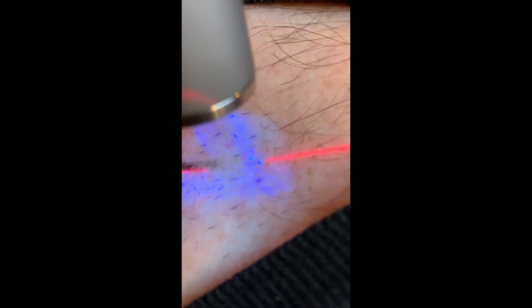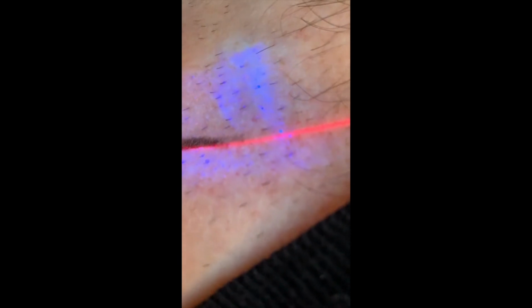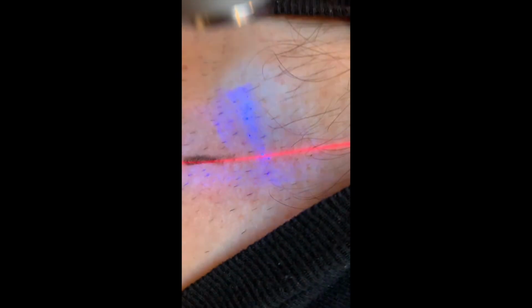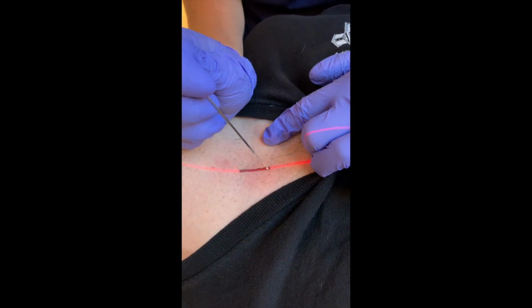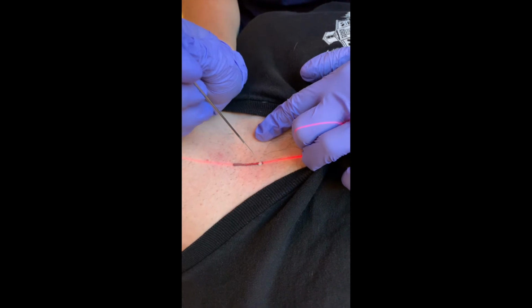As with any tattoo, these tattoos may fade with time. UV tattoos typically will fade faster. If the UV tattoo fades during this time, it can lead to your treatment team having a difficult time finding it as well as accurately setting you up. Should this occur, there may be a need for the treatment team to tattoo you again, this time with a standard black ink. This will allow for the visibility of the mark and continued accuracy of your setup.